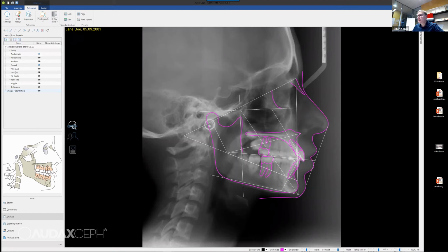Then what we did is a mandible redesign. We had a mandible before, which was different from this one. Now the technology has changed and is similar to the technology of the profile of the patient. So we can move those points around and have something like this. One thing available here, if you don't want it, is to have no coronoid, so it's not visible if we don't want it. But let's have the whole mandible.